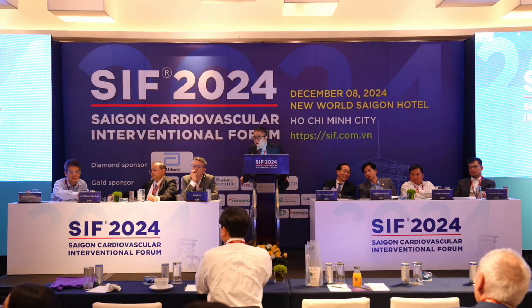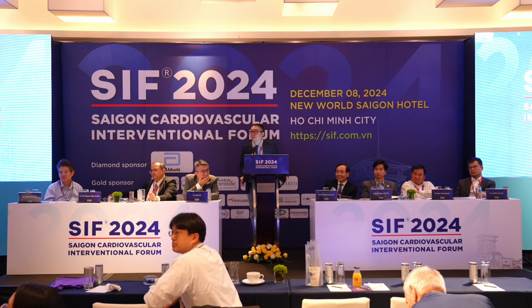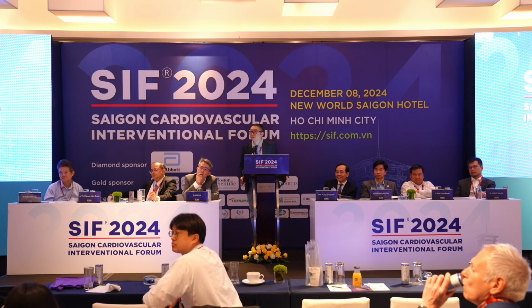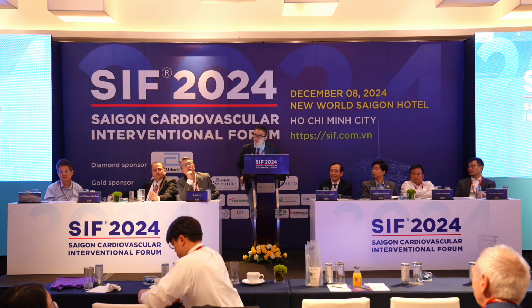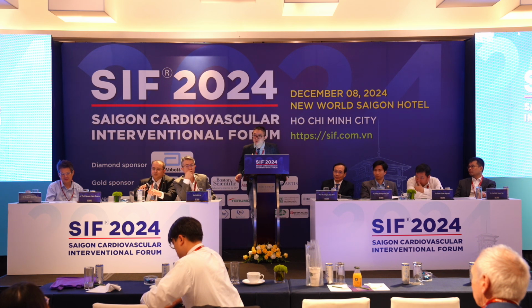I have another choice. I think that we can use the thrombus catheter to selectively infuse the adenosine or the nitroglycerin. I think you can infuse via the thrombus catheter selectively to the distal part of the LAD. I think it's better than infusing everything in the left main, like your case. Yeah. Actually, I use the microcatheter. I use a dual lumen microcatheter to inject the adenosine and nitrate. And thank you for your comment.